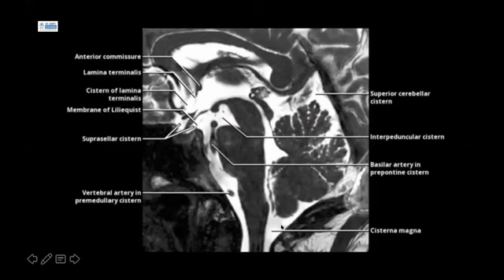And this is really the same anatomy on a sagittal MRI image. So again, pituitary region, suprasellar cistern in here, region of the third ventricle, cerebral aqueduct into the fourth ventricle, foramen of Magendie, cisterna magna, pineal gland, tectal plate, corpus callosum, anterior and posterior pituitary, infundibulum up into the hypothalamus, and the optic chiasm.